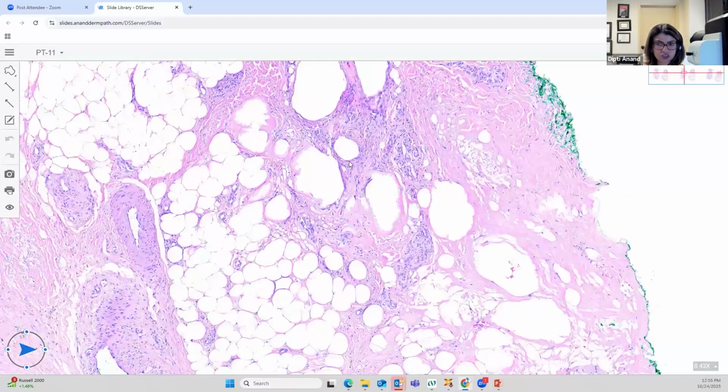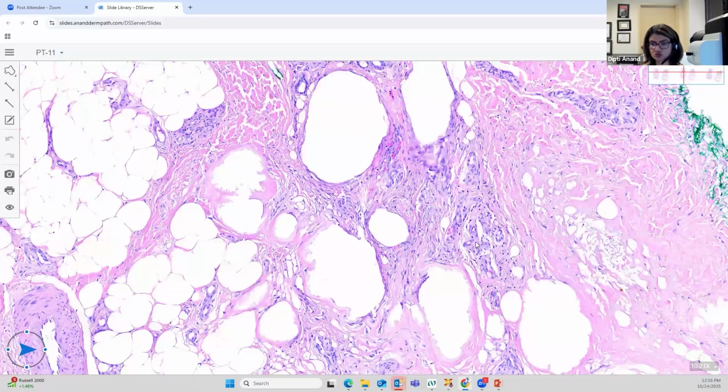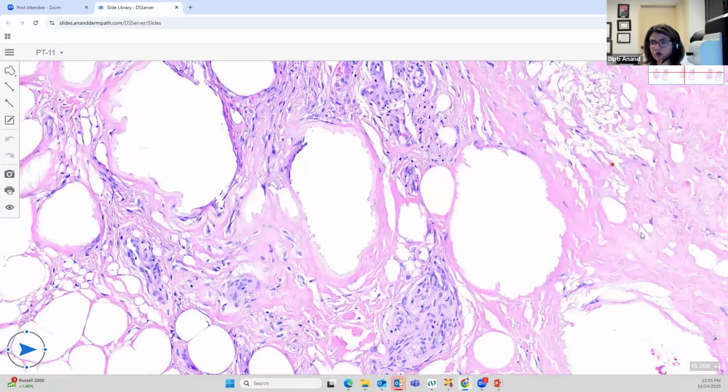So pink fat necrosis, no inflammation, minimal lymphocytes, histiocytes and hemosiderin can be seen, and this nice membranocystic change where you see these large fatty cystic spaces which are showing this kind of feathery outline. That is classic for lipodermatosclerosis or hypodermitis sclerodermiformis or sclerosing panniculitis. Is that clear up till now?